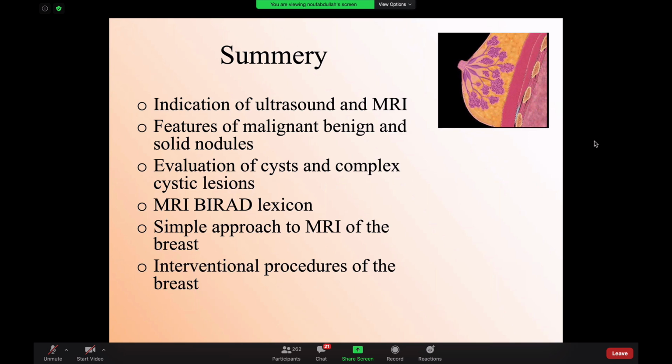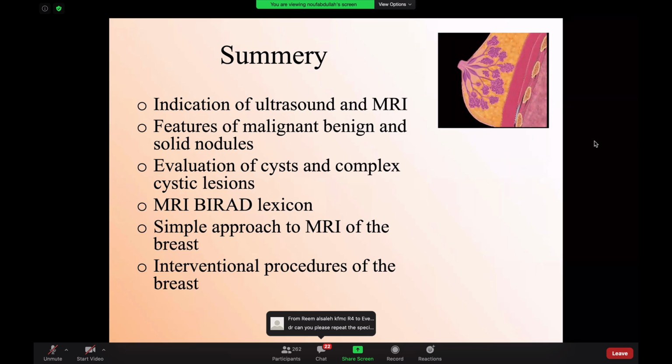Usually it differentiates between soft and hard lesions. So soft lesion like fibroadenoma, like cyst, hard lesion like malignant lesion. But keep in mind that there is significant overlap between this. And that's why it's very difficult to be utilized at resident level in differentiating BI-RADS 3 and BI-RADS 4A lesion.